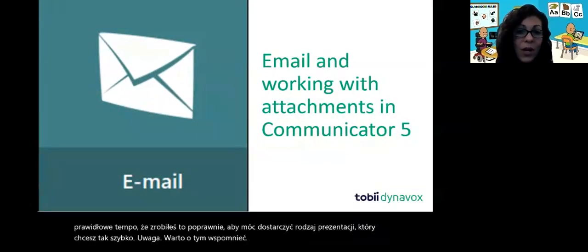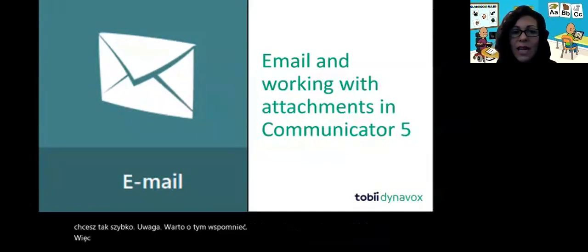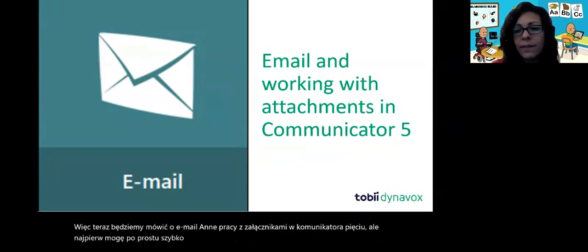So now we're going to talk about email and working with attachments in Communicator 5. But first, I can just quickly ask if anyone has any questions. Maybe Kasia would like to summarize.